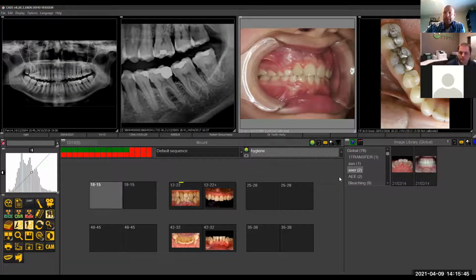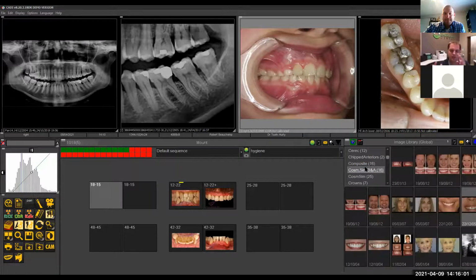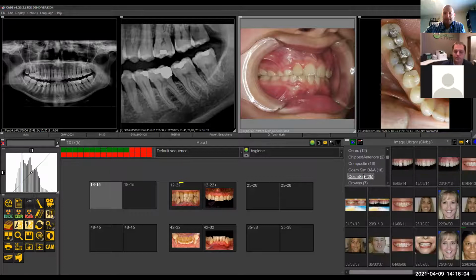One thing I had a question about was smile design. So you had those simulated pictures. I know on the pro version, I think I bought, you can distort things and whiten things and get a simulation, put in some library drop-ins. Let's say I had a full face picture and I wanted to drop a simulated smile into that. Is that something the software can do? I know there's some of those softwares on the market, and is that something I'd have to do separately?